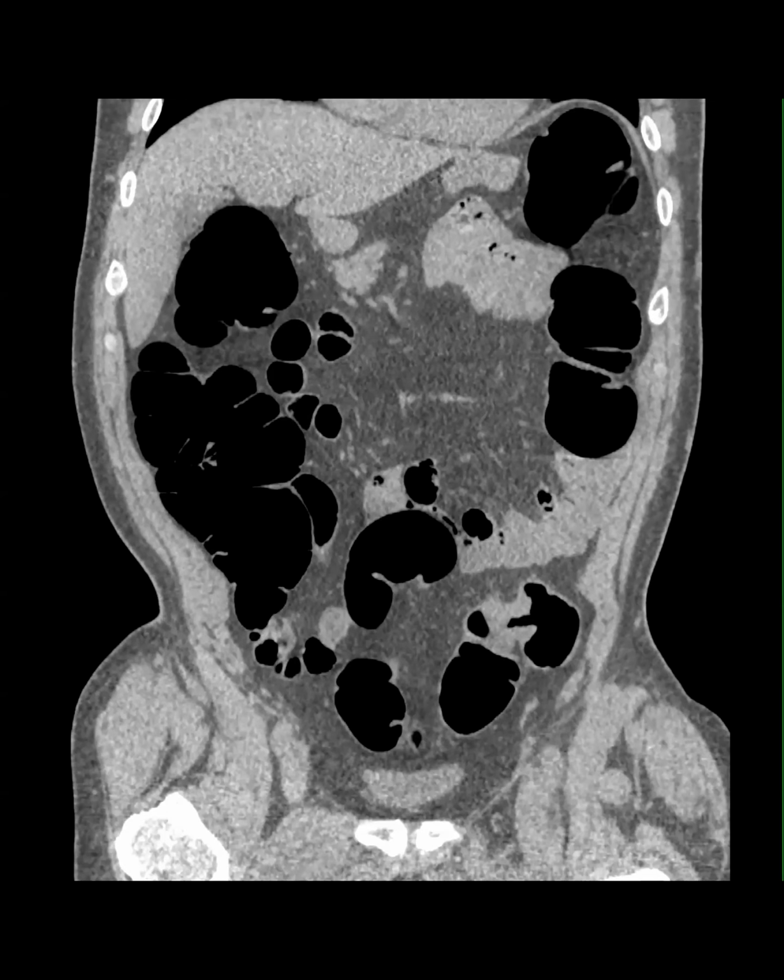Cool. Did he have any bleeding? I think the patient was symptomatic and then got this. This was an old study. I was reading a follow-up study.